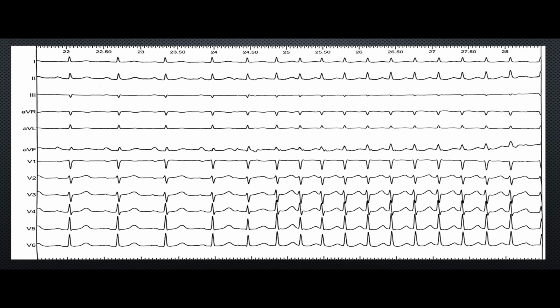In the ECG, what we can see is that on the left hand side, there is a rhythm going on which is regular, and on the right hand side, there appears to be a tachycardia. So this is basically a sinus rhythm that was going on, because we can see that the P wave morphology and the axis are just like a sinus beat, and the firing rate of the sinus beat is within the limits. So it is a normal sinus rhythm that is going on.